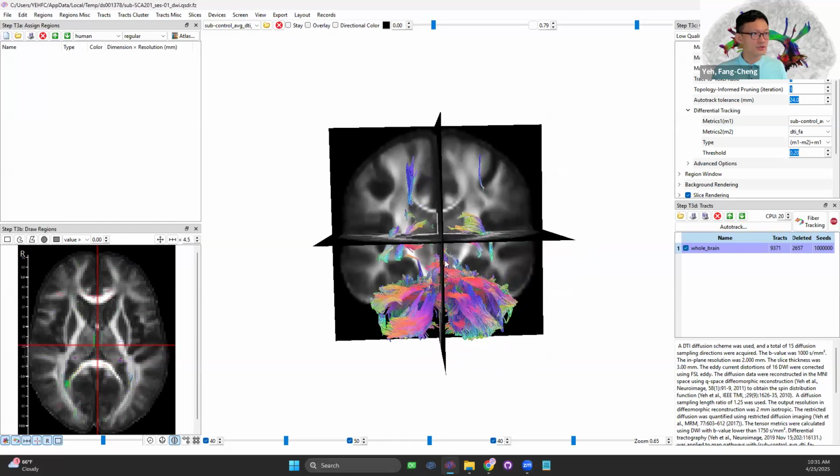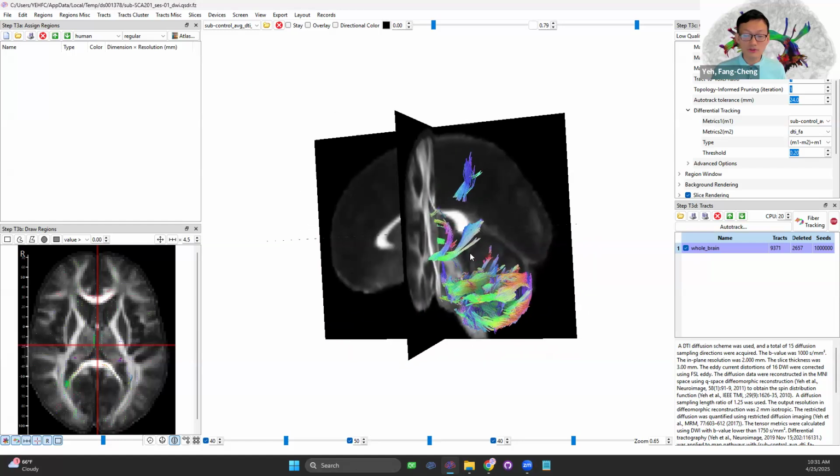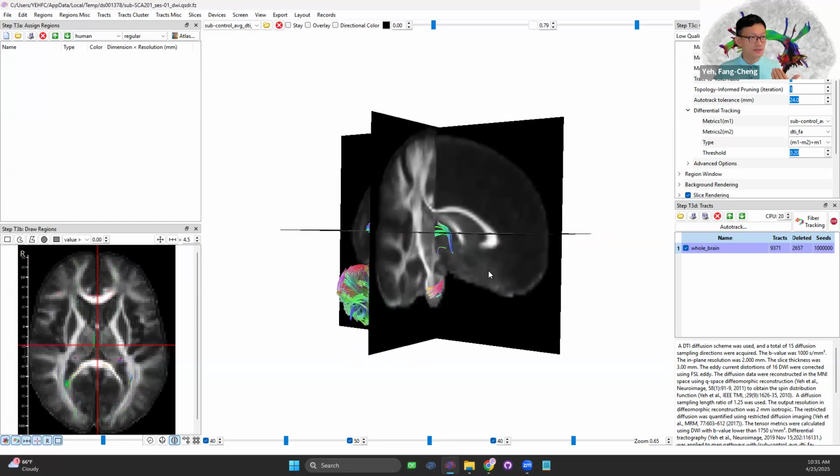You will see a lot of findings showing up in the cerebellum, and it's getting many more results than in the longitudinal study. This makes sense because the longitudinal study only maps the difference between two time frames. But before the baseline study, the patient may have been going through a lot of neurodegeneration, and this disease affects mostly the cerebellum, which shows up here.